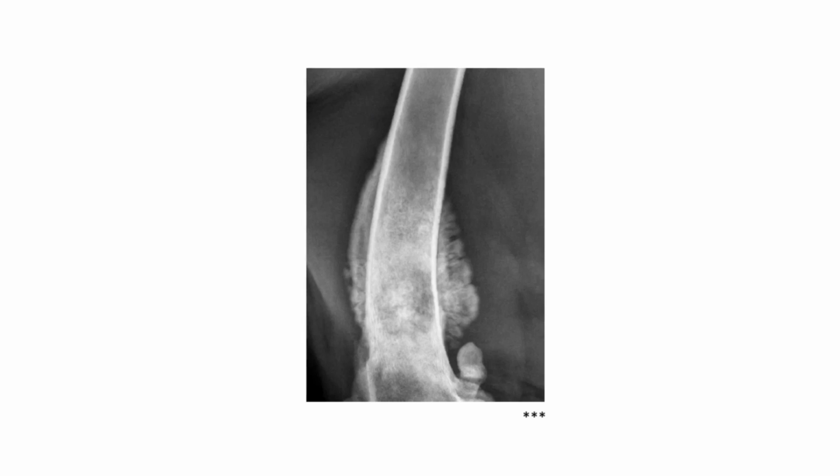In contrast, we have a lateral view of a distal femur, and there's a whole manner of features that are compatible with aggressive bone disease here. There's permeative lysis, and we've got this raised, highly irregular periosteal reaction, and potentially some evidence of cortical destruction as well. The thing to take away from this radiograph is that the zone of transition is really impossible to see.